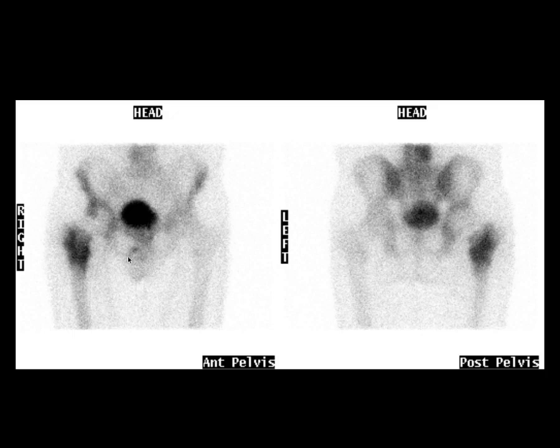Here's a patient with an infected total hip replacement. Slightly unusual appearance here. The acetabular region is normal and the infection has only showed increased activity in this area, but this can occur, and this was proven by aspiration of the joint.